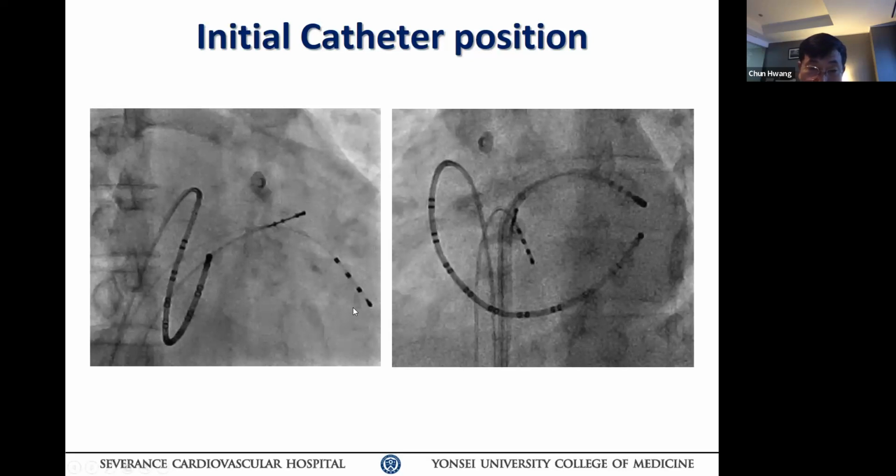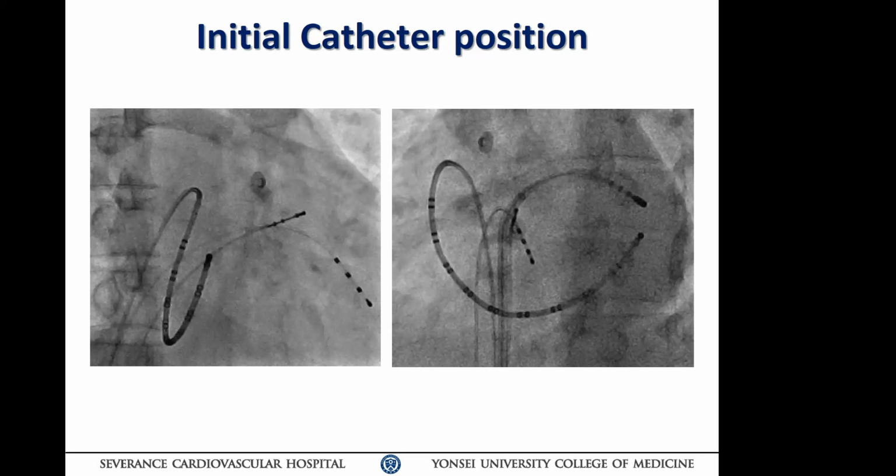Where is it? In the septum. His bundle is straight up, and in the LAO you can see it. From there, imagine how far your RV septal pacing has to travel to reset that left side pathway versus your septal His bundle recording pathway. Very much different, right? Yes, that's a huge difference.